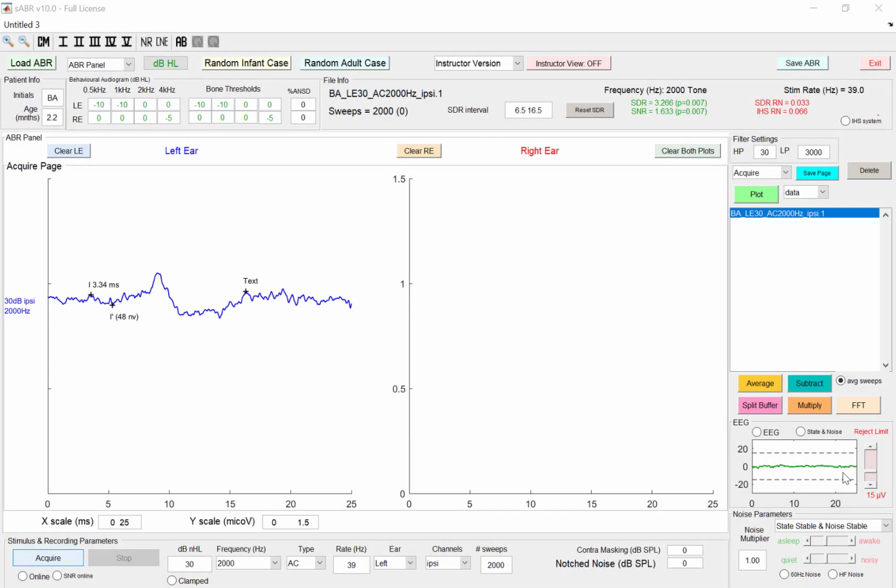And the last update we wanted to talk to you about was the 60 hertz noise. We'll go back to the EEG. Here it's going on. We're going to turn this so it goes to a flat line. Everything turns down, or we can just turn the noise gain down to 0. We don't have any noise now being recorded or shown in the EEG window, but we've updated it so we can really see that 60 hertz line cycling.